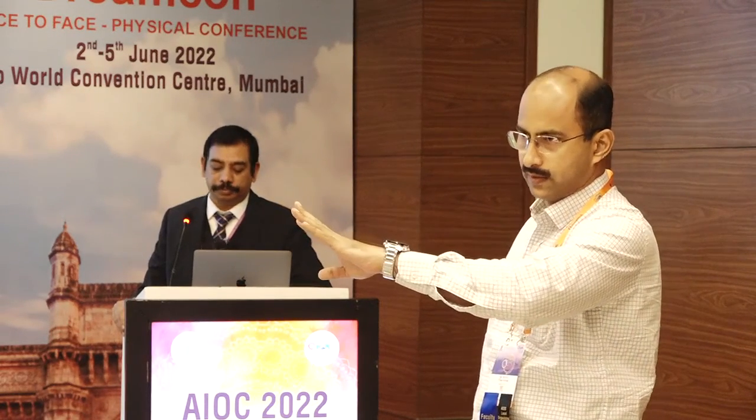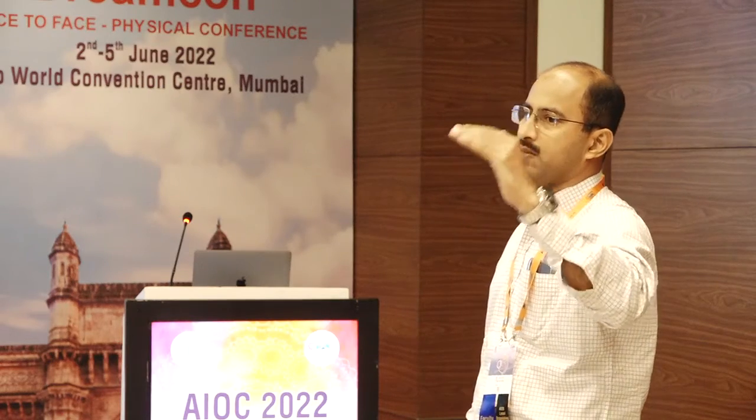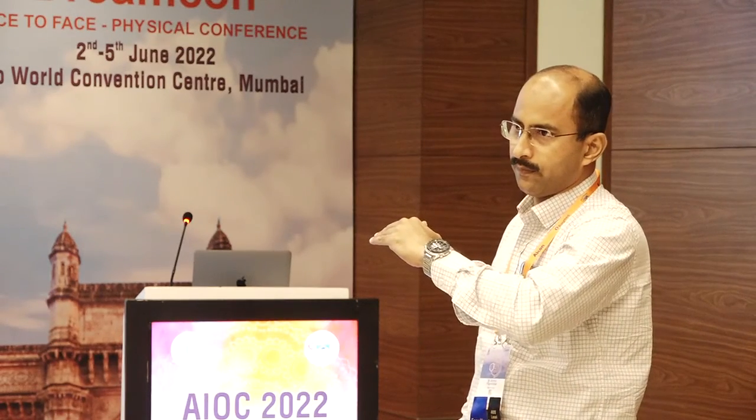The database is finite: 500 Europeans, 200 Caucasians, 250 somebody else. It cannot be representative of the entire population. So the apex of what we call evidence-based medicine would be comparing the patient's own scan over time. In fact, for Spectralis you don't need two baseline scans, only one good baseline scan is sufficient, and you compare it over time.